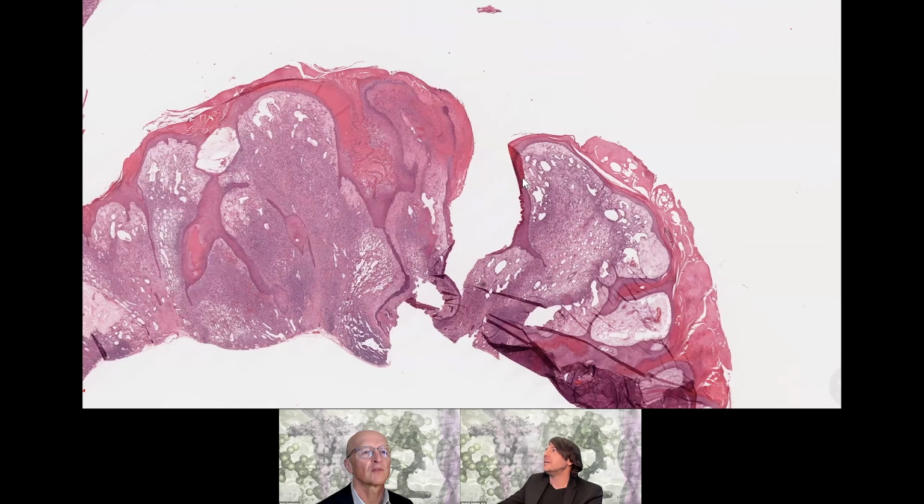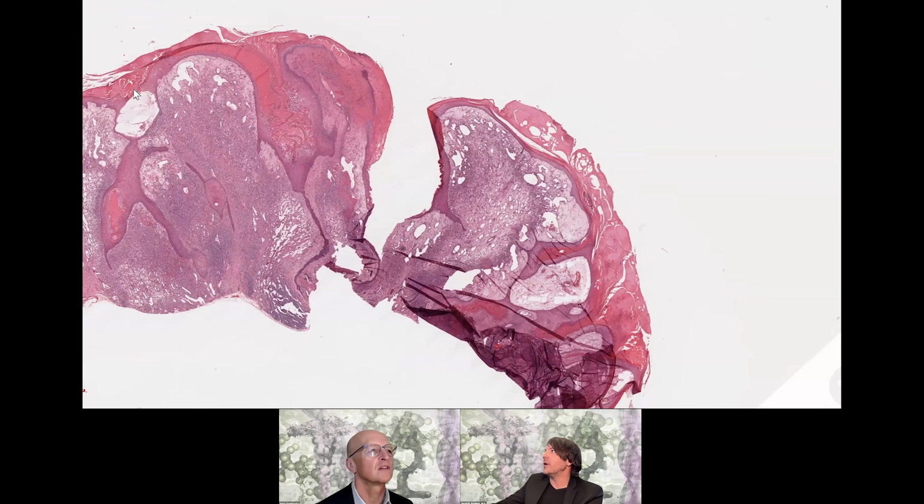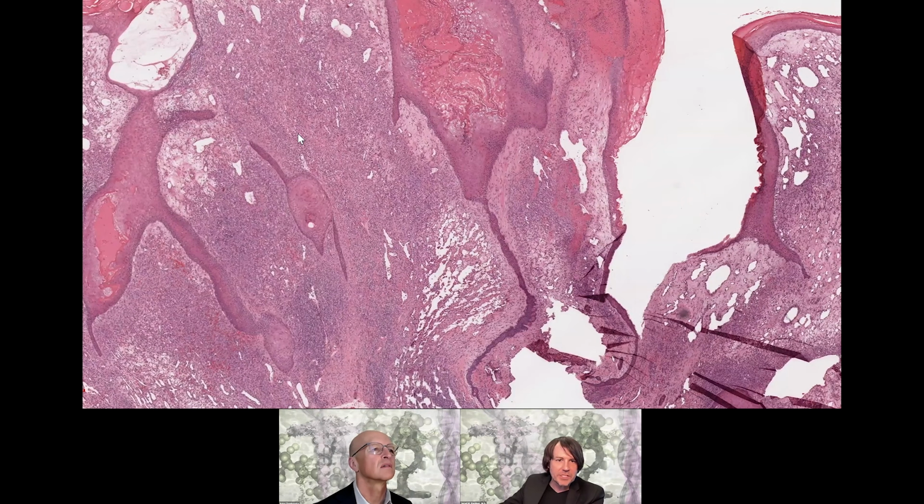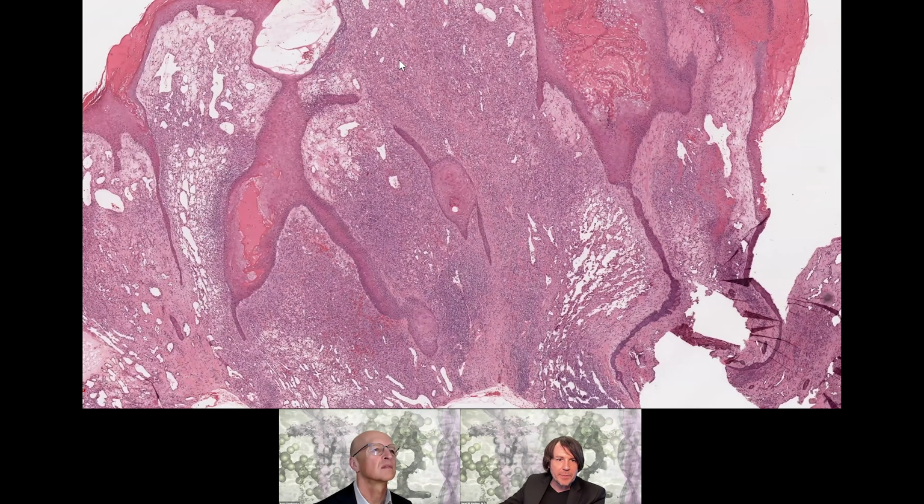And then there's some kind of vascular component and inflammatory component. And tons of edema, right? A lot of papillary edema. The dermis is just so loose with edema in the background wherever there's not vessels.